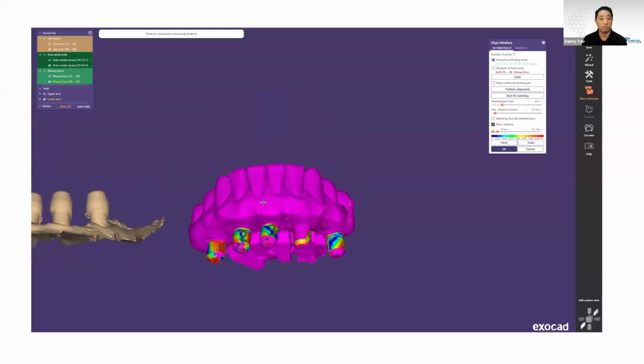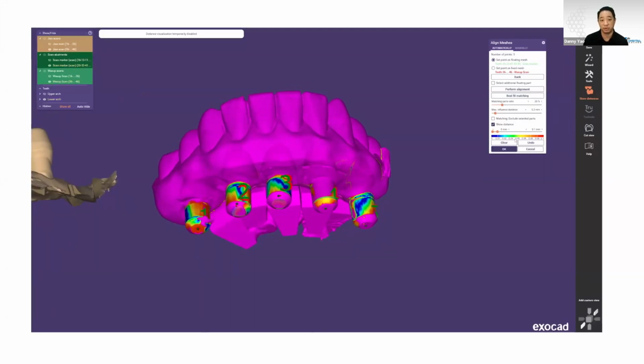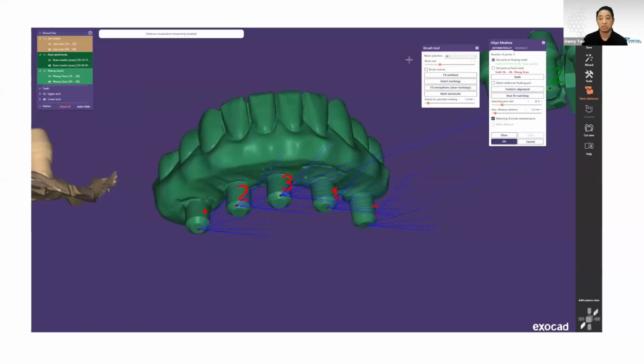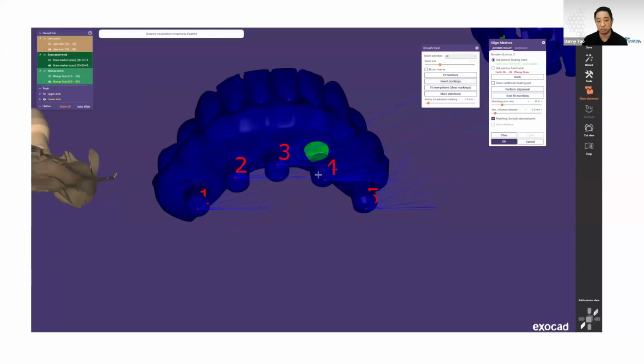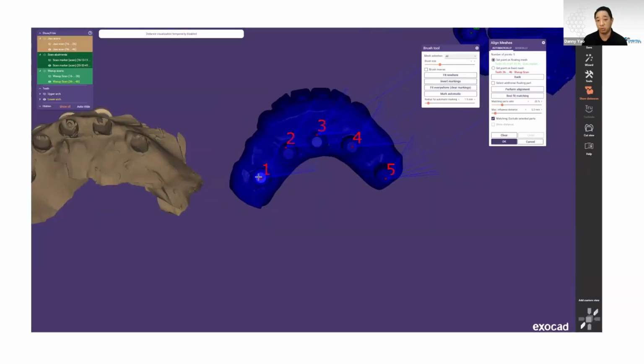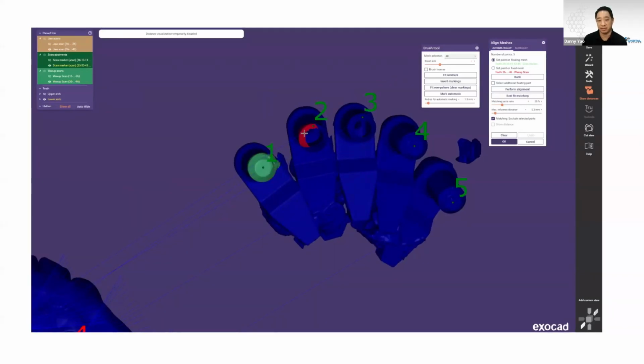In this case, we weren't that happy because what we're most worried about is the vertical, and you see there's a lot of purple in that vertical. We want to see as much blue as possible. So we're going to match excluding parts again. Again, the dark blue is stuff that's going to be ignored, and anything that's painted green now is stuff that's going to be taken into account as the common data that is in both of these scans.